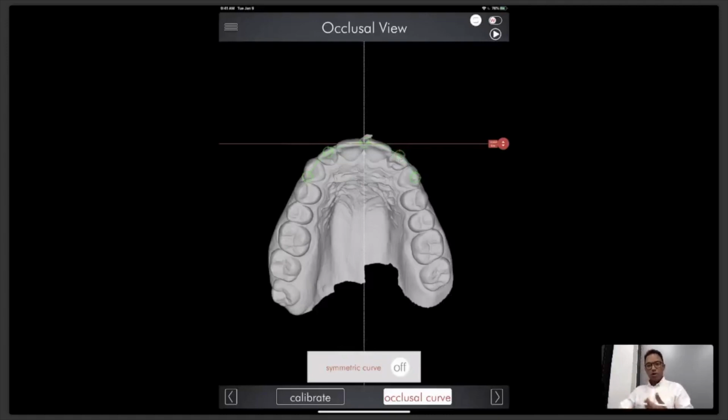So along with your dental knowledge, and according to your clinical exam and your x-rays and all of the other documentation that you may have, or findings that you may have from the occlusion of this person or any other findings, you will then decide here where you want to place that incisal edge of the new smile.